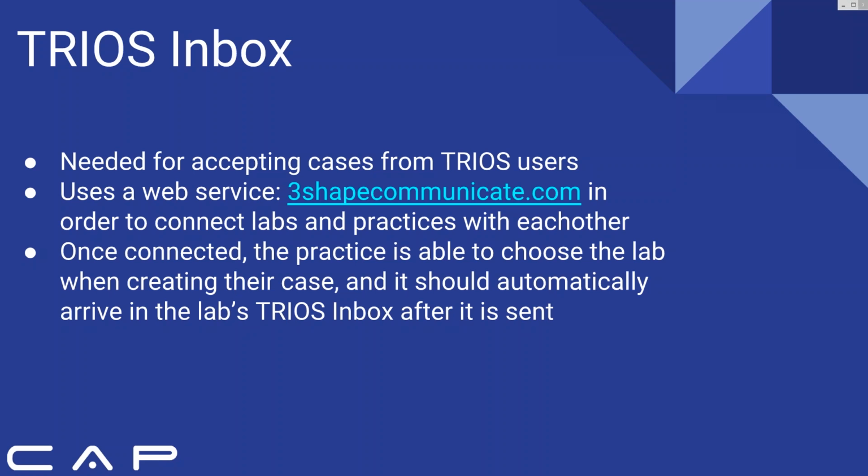Once you've logged into the service, you're able to send your email or get an email from various practices and labs in order to connect on the website. And once you guys are connected, the practice or the Trios user is able to set up an order in their system with any lab that they're connected with. That way, whenever they're finished with that case, it'll automatically send off to that lab that they've chosen. So you won't technically need to log into the 3Shape Communicate website after you've connected, because it'll automatically just show up in your Trios inbox.